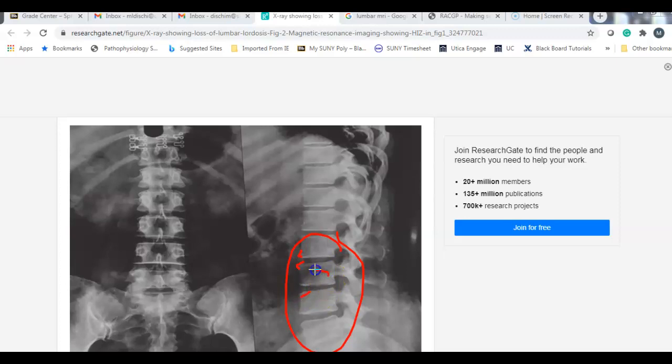And interestingly enough, they've lost a little bone in this one, and that may be they have a secondary condition. It could also be, oh, this is definitely a female because of this. Do you know what this is? Yeah, you know what it is. It's going to be the hooks on their bras. You really should take that off. Always should have all metal removed. Okay, which I'm sure you know.